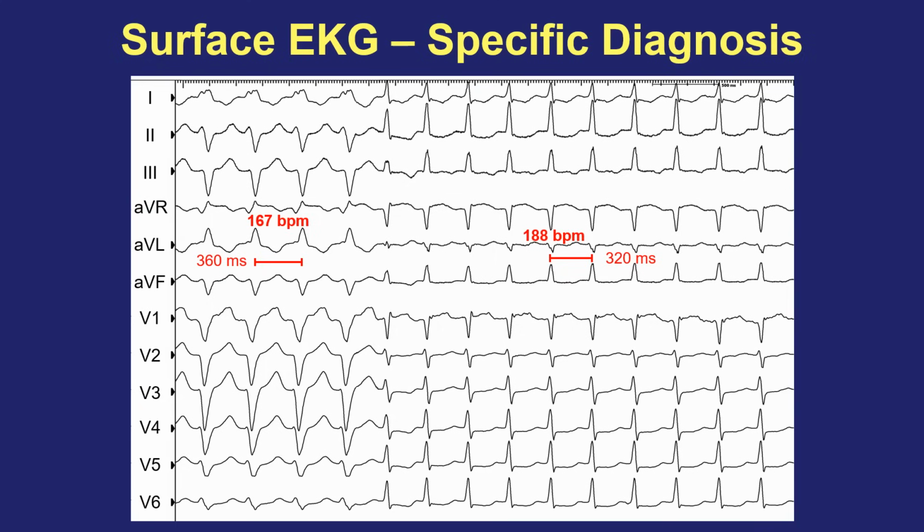So what does this mean? It's certainly possible, I suppose, you could have 2 different tachycardias, one switching into the other, but that would be unusual, and there's actually a more elegant explanation when you see this, a bundle branch block that either appears or disappears, creating a narrow QRS or having it disappear.